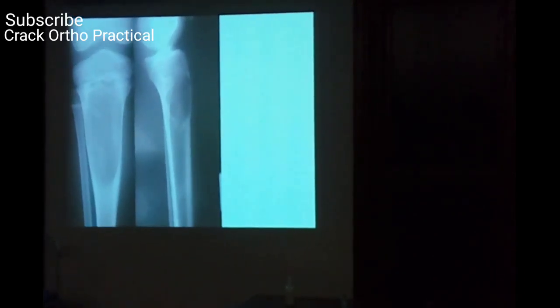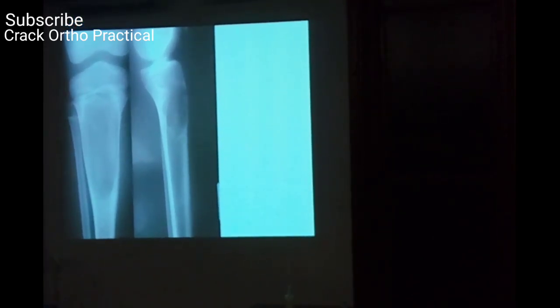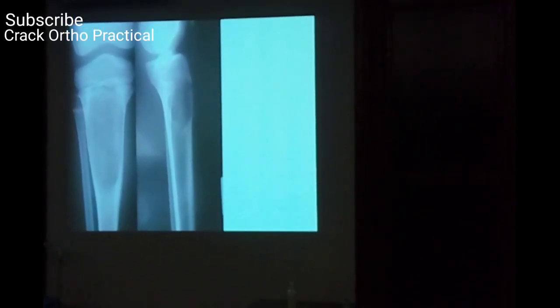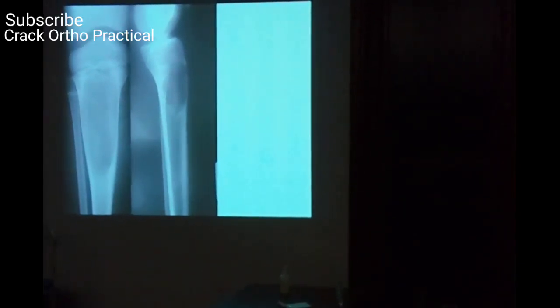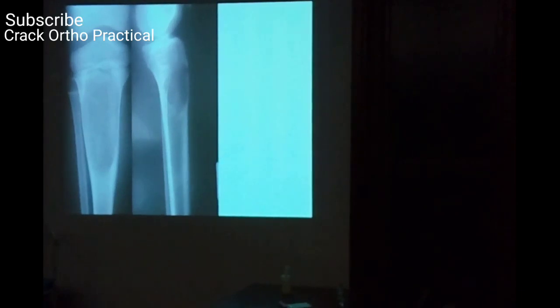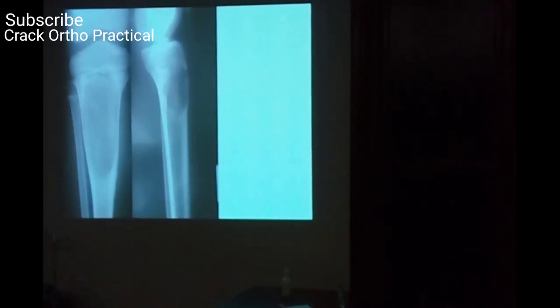There is a skeletally immature individual with a lytic lesion seen in the metaphysis of the tibia, with a clear matrix.